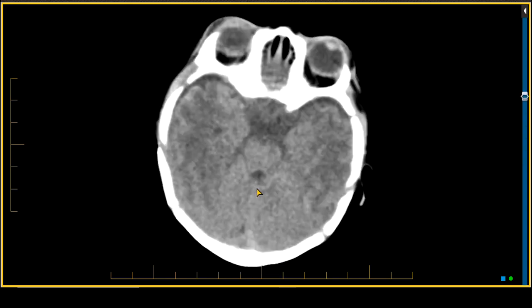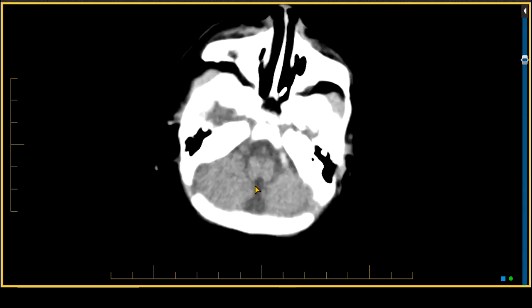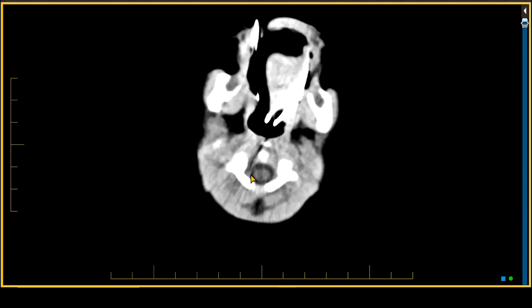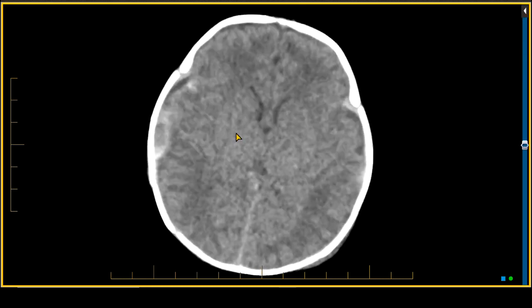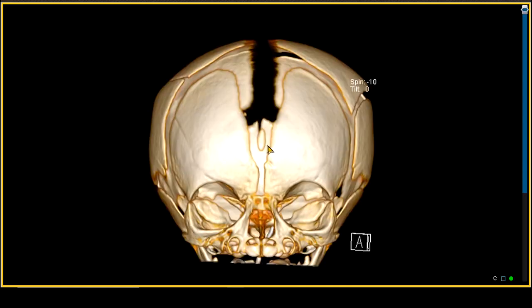The patient was scanned serially, but before that, I want to make one point about fractures in the infant. We have found that creating three-dimensional reconstructions of the calvarium have been infinitely valuable in detecting fractures.